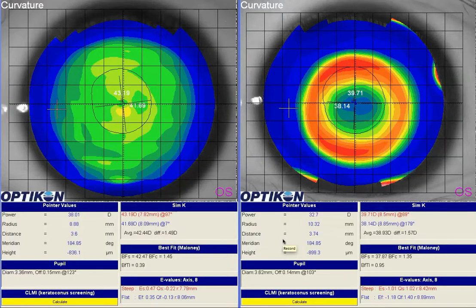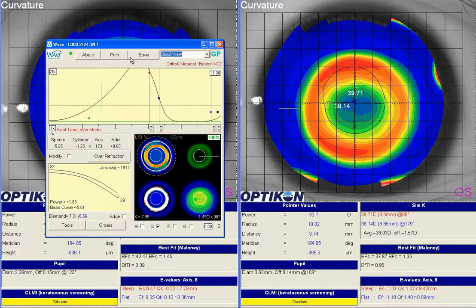This is an orthokeratology case. The patient's worn lenses for a little while now, and there's a concern that there's a little bit of undercorrection after treatment, as well as a small treatment zone. I'm going to bring up the lens that the patient is wearing, and it gives us an idea of kind of flat cornea, kind of high RX, and our lens is understandably pretty flat.